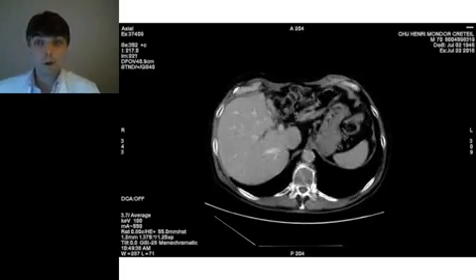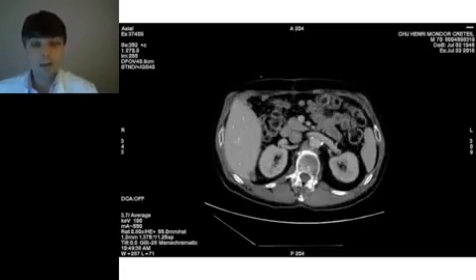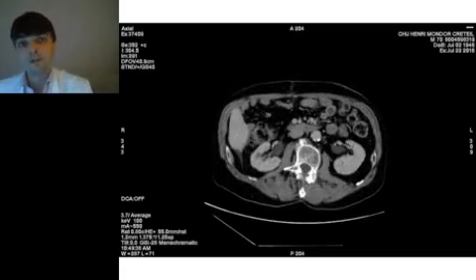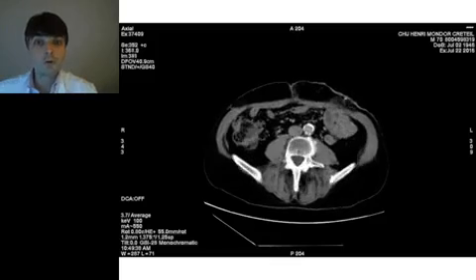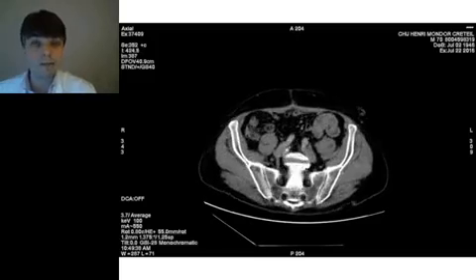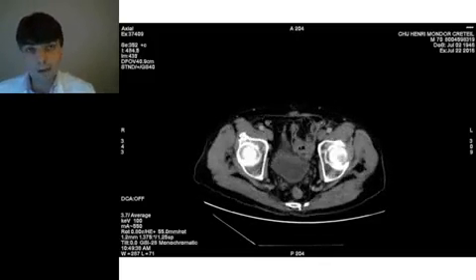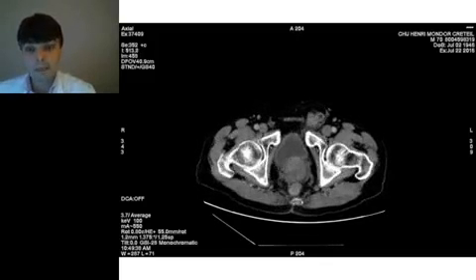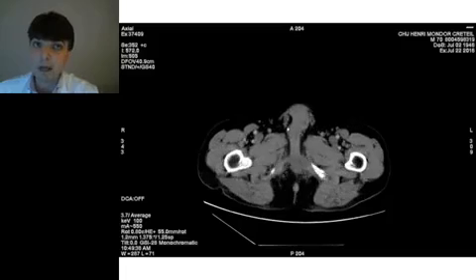First message, of course you can use spectral imaging to make thorax, abdomen, and pelvis acquisition. I mentioned you have to have a similar workflow as the way you are used to in clinical practice, and that's the demonstration. You must use spectral imaging where you want to use it. If it's thorax, abdomen, pelvis in an oncology situation, and definitely in oncology situations you have to make whole body acquisitions, well, there you can. Second thing is, if you use high energy levels, you reduce the contrast. That's maybe not the best option if you want to look for hypovascular lesions within your liver.